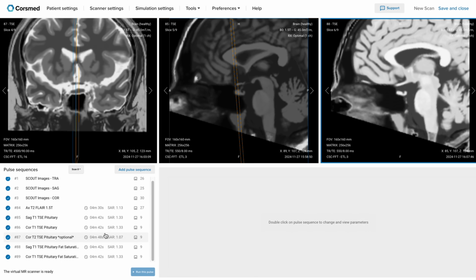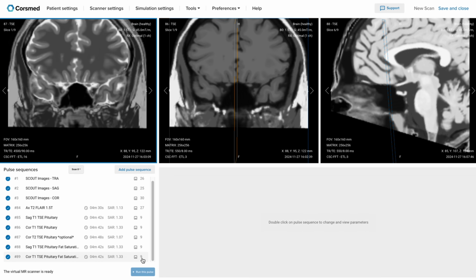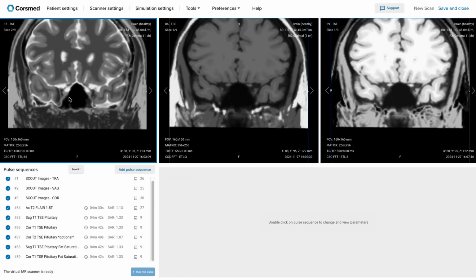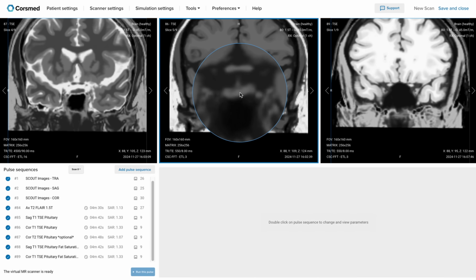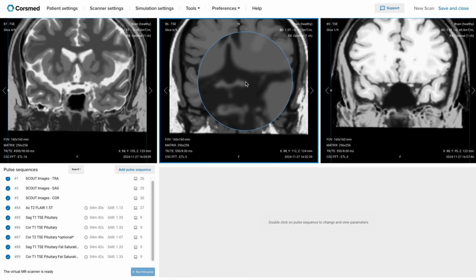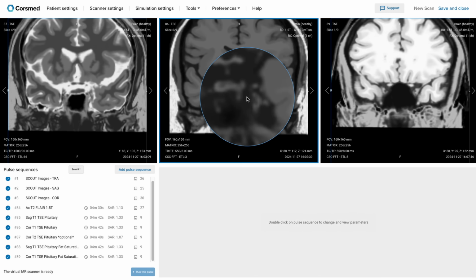On the other side, I also want to see the coronal image. So I'm going to upload my coronal T1 in the viewport here. Since I've also scanned a T2 and a T1 post-contrast sequence, I have all the images ready here. I will scroll to the slice where we can clearly see the pituitary gland, which is located around here. As you can see, we have the infundibulum extending upward, the optic chiasm, the pituitary gland, the sella underneath, and the clivus.